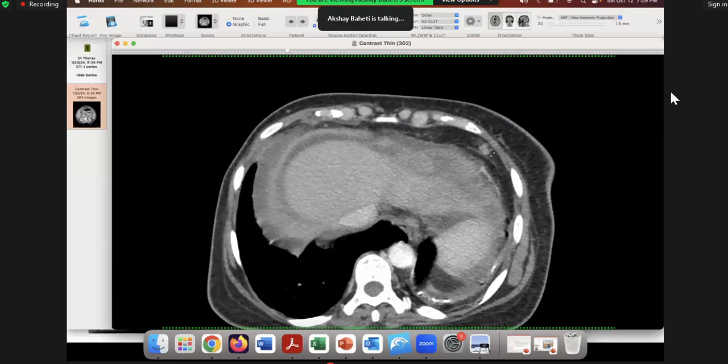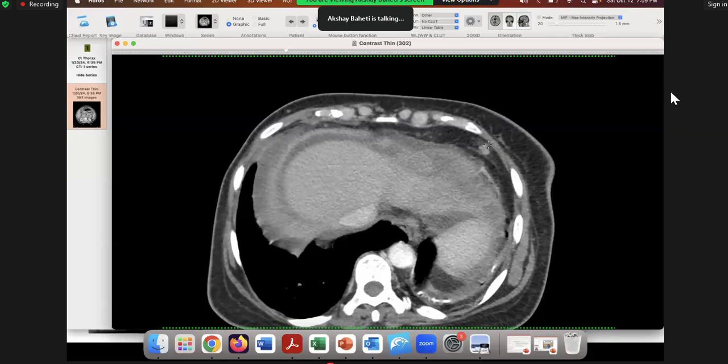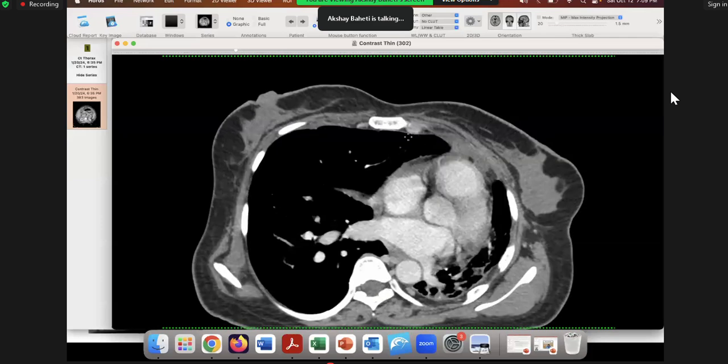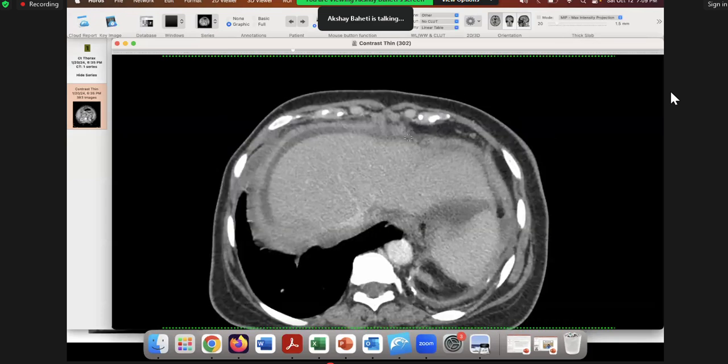Okay, epiphrenic is a different one to differentiate because they are the drainage site of peritoneum, which means that even mildly enlarged nodes can be just reactive to the peritoneal disease, or they can actually be metastatic. So it's difficult to be sure. Okay, but this one, yes, this is pretty small, so I'm not worried about that. But internal mammary, yes, this one I think is definitely looking worrisome. All right. So remember that. So ovarian cancer, definitely look at peritoneum, but also look at nodes.